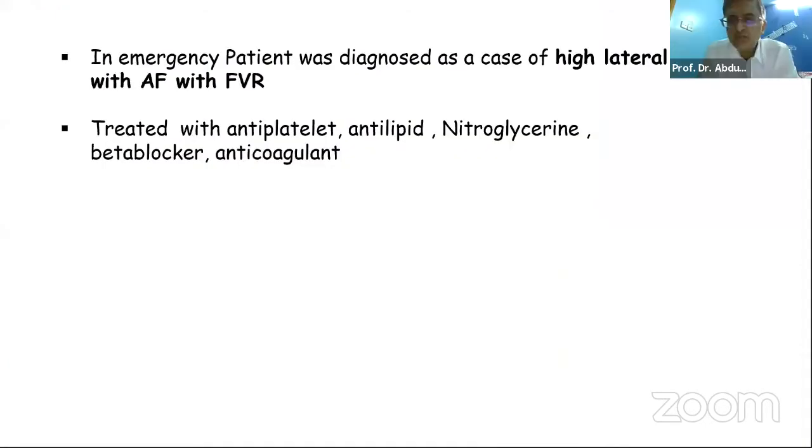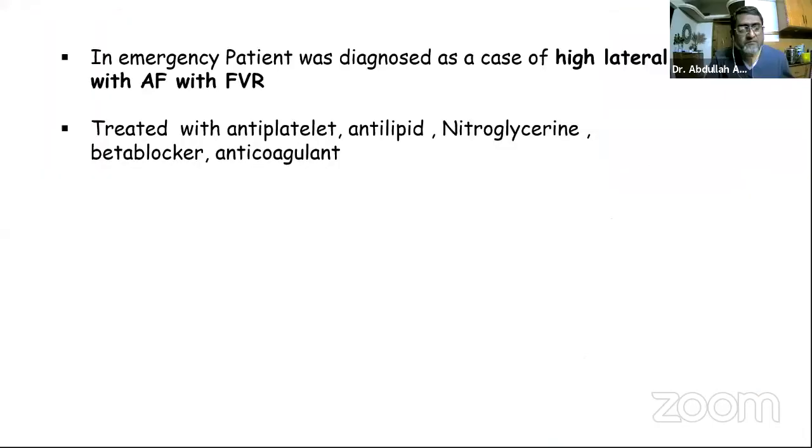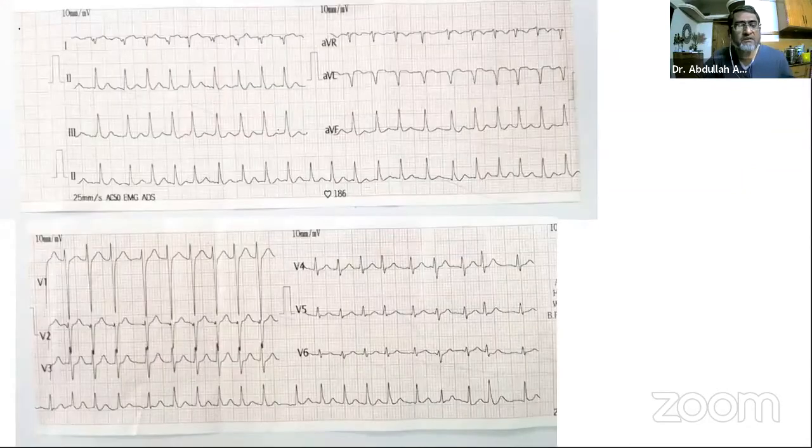Yeah, I'm just curious about lead 1 and AVL. Did we ever consider lead swap? There's something wrong with the leads. Most likely, sir. Most likely, because the leads seem to be reversed.